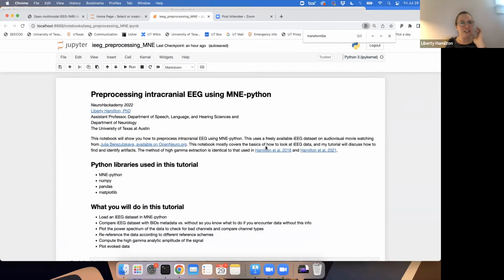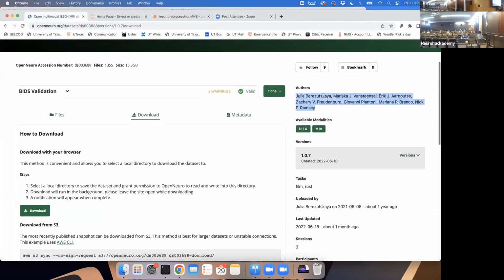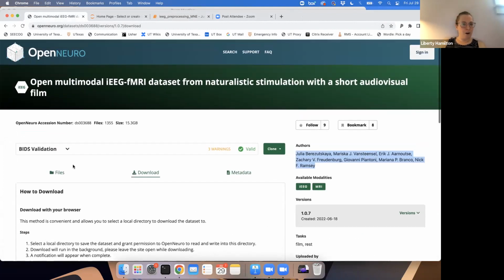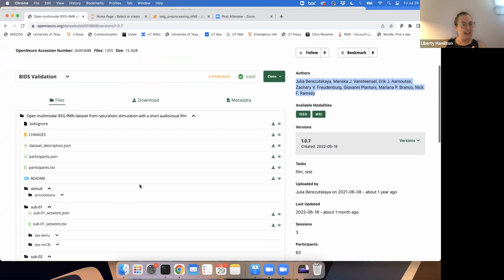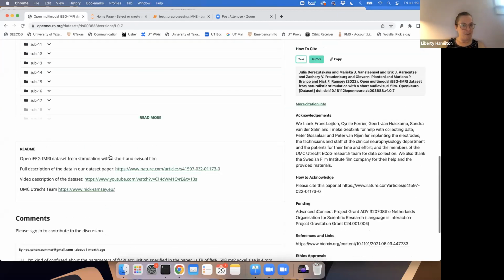Yes. Okay, great. So this is our notebook, and we will be looking at data from a freely available intracranial EEG data set that has a lot of data from Nick Ramsey's lab. Julia Berezutskaya is the person who curated this data set. And this is from a number of people who are listening to and watching a short audiovisual movie. And so they have a number of different participants.